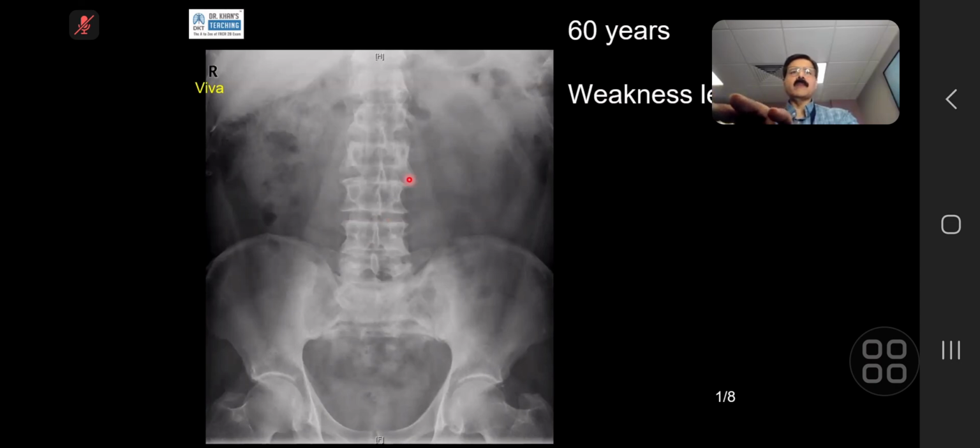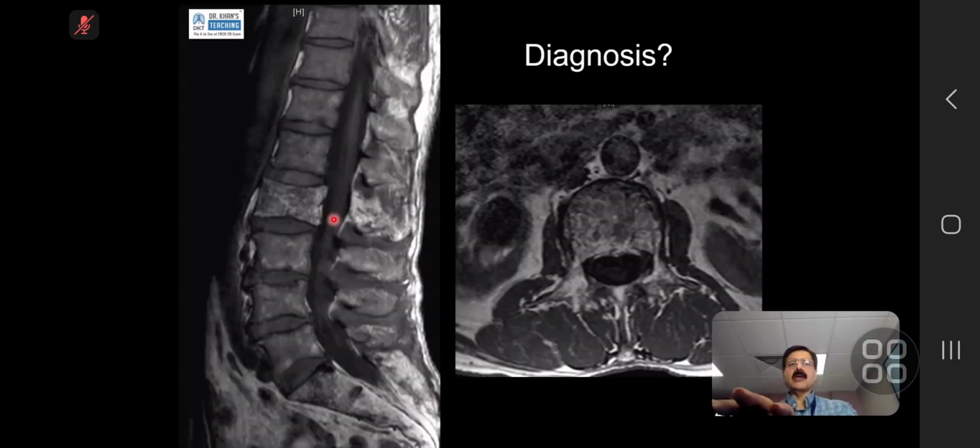If you see here, look at the mediolateral dimension. It is slightly bigger. It is a subtle finding, just from here to here versus from here to here. And you will agree that this is more. But here, that is confirmed. Now, the marrow is normal, and you did well where you just described it. It's normal. Low T1 is bad. This is high T1, which is good marrow. So the finding is just that this is Paget's disease. End of story. Now, this is another. Can you describe it? This is Paget's disease, but just describe the findings for me.